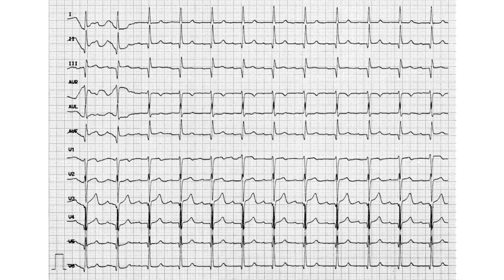So we do that, and we start checking, is it regular or not. I think the main reason I took this example is just to highlight the funky business going on in the beginning. Oh, it's an exorcist, man, what's going on? No, it's not an exorcist, it's just the guy sitting down or whatever.